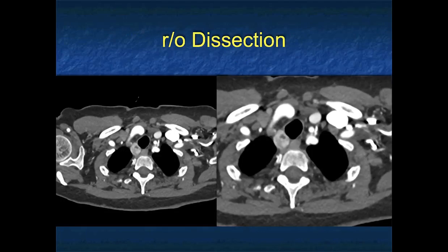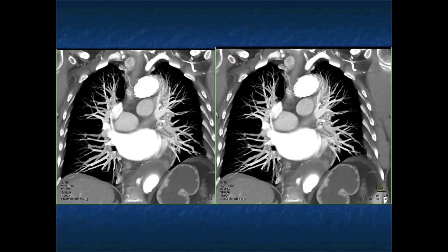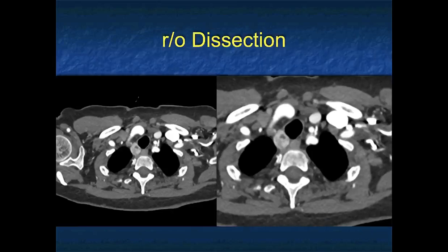This patient was done to rule out dissection, and what you see is a mass to the right of the trachea. It's a bit under 2 centimeters and it's vascular. You can see it very nicely toward the apex on the coronal and 3D coronal views. What could this be? Well, it could be a node, but it's vascular. Castleman's disease, can it be a vascular tumor like a paraganglioma? Not a great location, but it's a thought. Although the patient was not being evaluated for an ectopic parathyroid adenoma, this is a location where you can see ectopic parathyroid adenomas, and this in fact ended up being an ectopic parathyroid adenoma. Just a spectacular case.